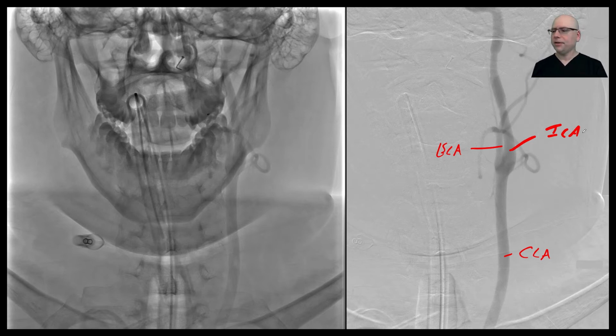And so I guess the other thing is neurologic, or radiologic convention rather. For X-ray, CT, MRI, angiography, the side convention is if you're standing at the foot of the bed of the patient, then this would be the patient's right side, and this would be the patient's left side. So this would be the left common carotid artery and its branches over the neck.